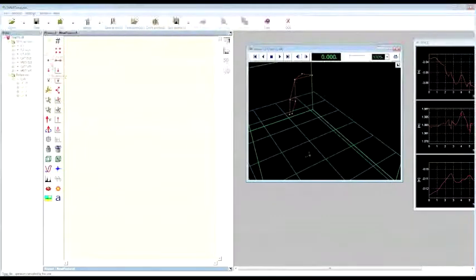First of all, it is important to understand how the tools are organized. On the first column, you have all what is related to 3D variables, basically everything that has 3 dimensions. So, for example, a 3D vector, a 3D reference system, a 3D point, a 3D velocity, acceleration, and so on. If you switch on the right side, you have similar tools, but for 1 dimension variable. So, for example, you have a scalar, a 1D point, and so on.